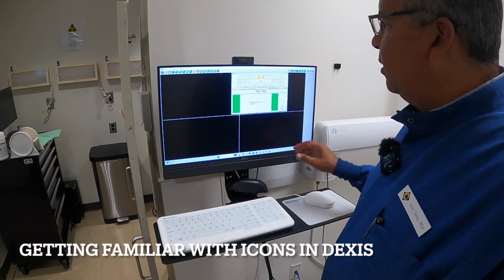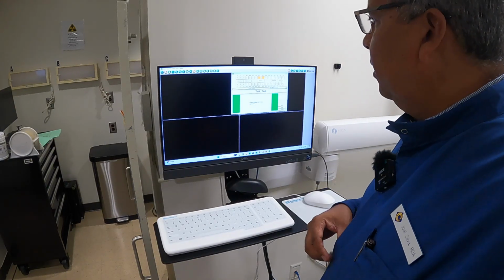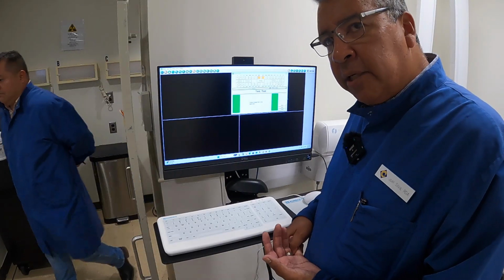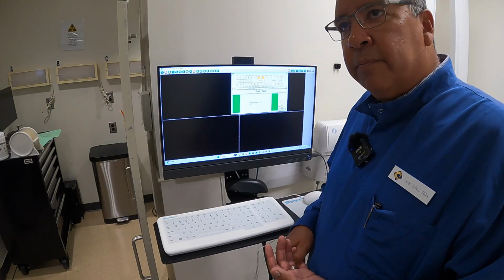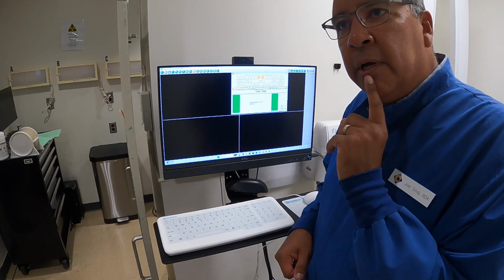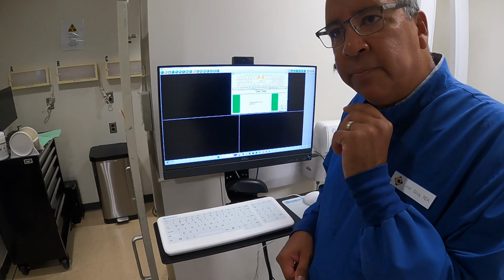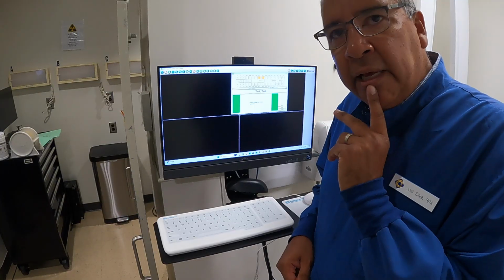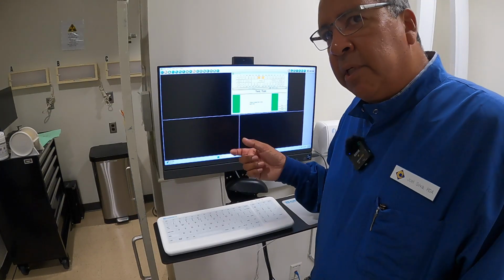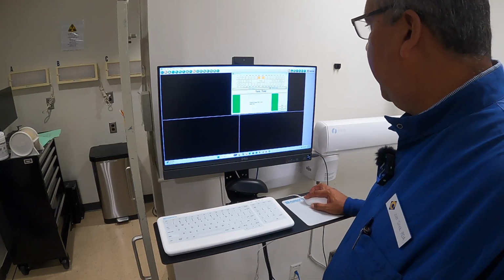And I want you to notice what is highlighted. The central teeth. So in regular dental offices, whenever we do a checkup set on your patient x-rays, we always include generally 2 PAs on the anterior, one on the upper, one on the lower. I'll go into more detail about PAs later, periapical for the upper, an x-ray on the lower, which is the same thing. But for our purposes, the dental board does not require that. So we are going to go ahead and press next.